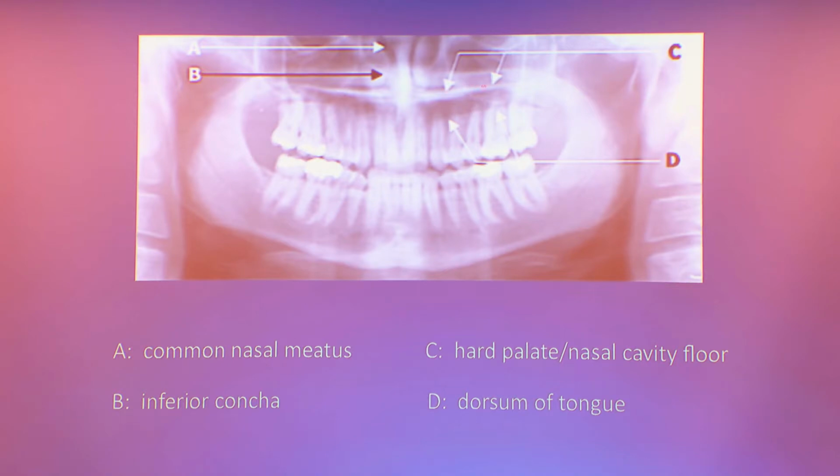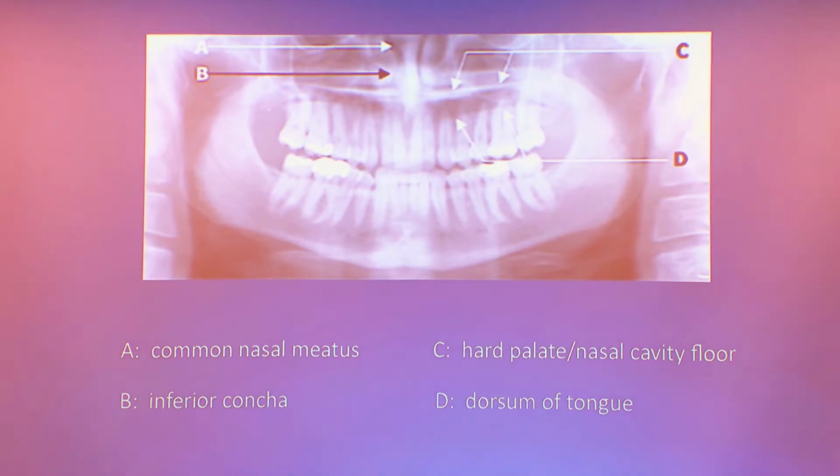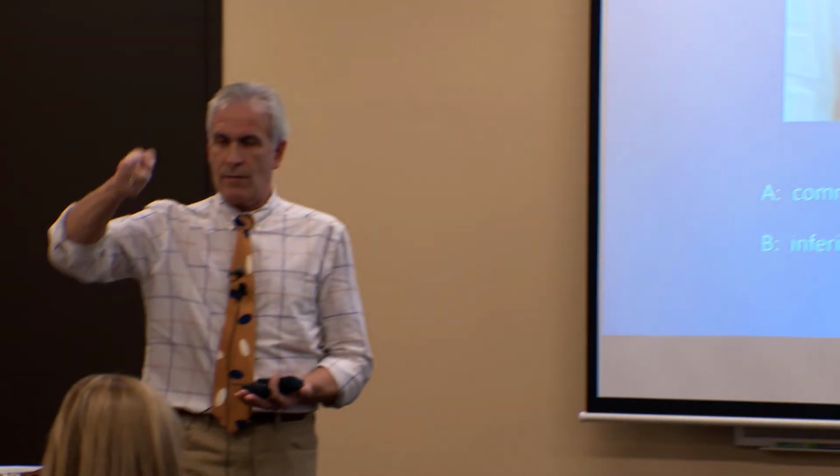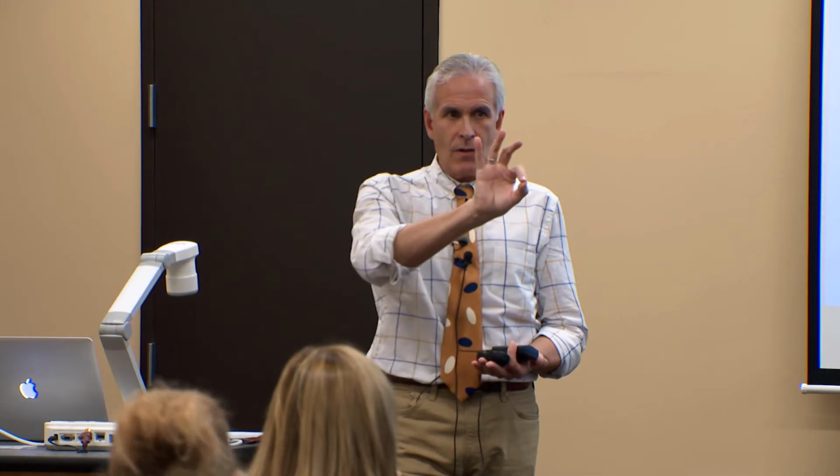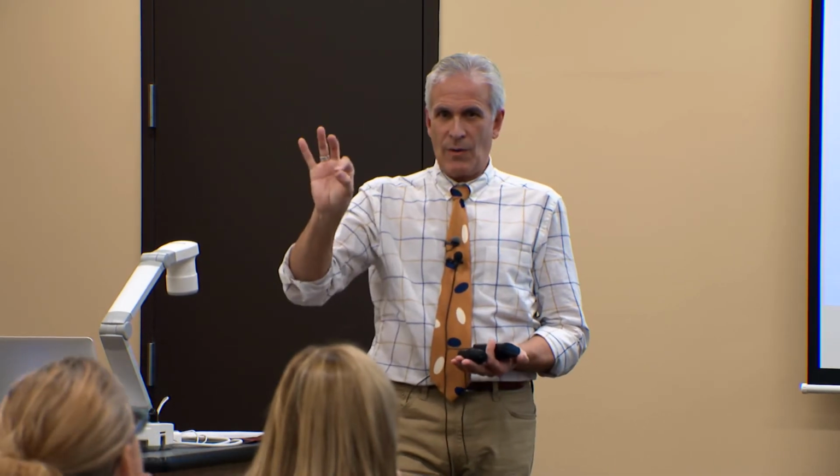Hard palate is actually all of this image from the opacity that is roughly from here up to here. So if you think of the shape of the palatal vault, it's a vault. While we're imaging it, if the receptor is here, the source is here, and you have this vault in the way, we're going to get a primary image of the bone here and a ghost of the bone here.